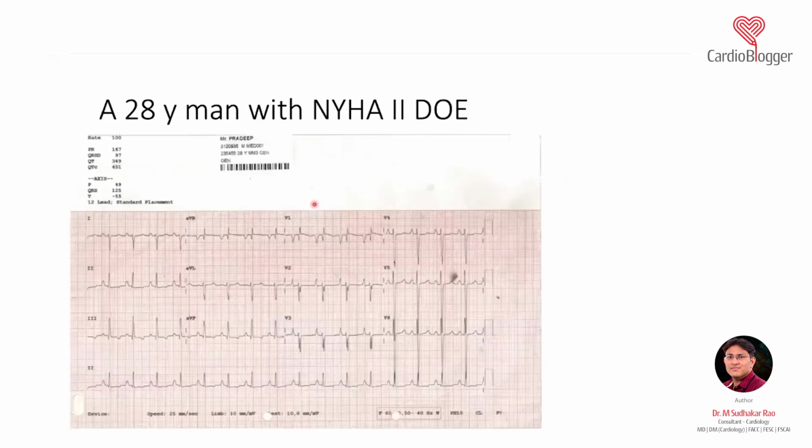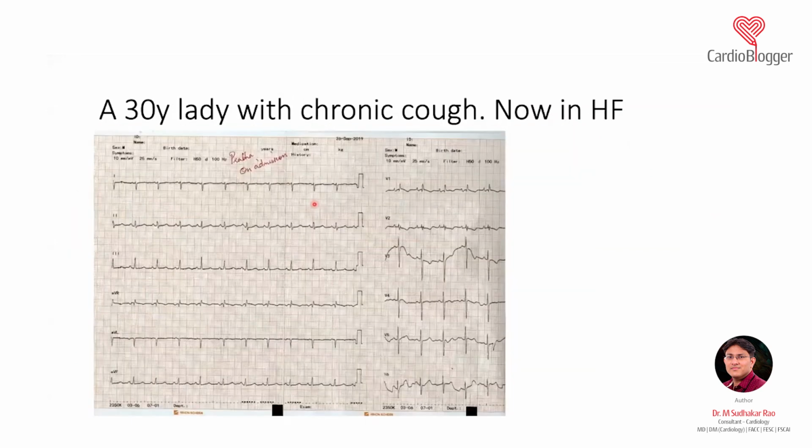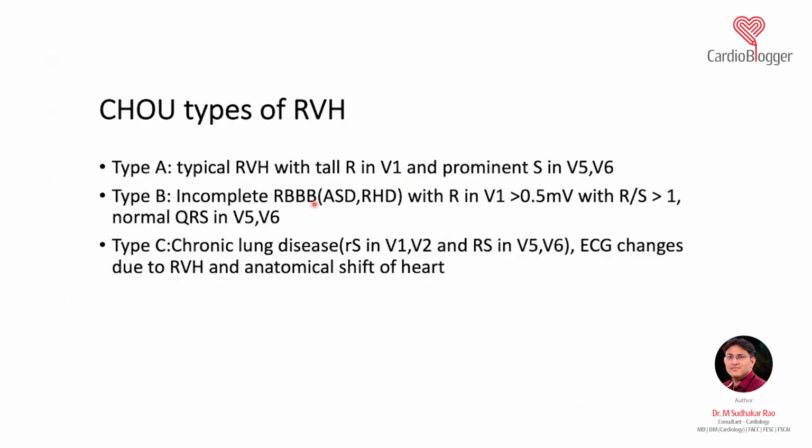I think one of the ECGs we have discussed, not this one, this is a typical form. Yeah, I'll show you an ECG where we have a type B.